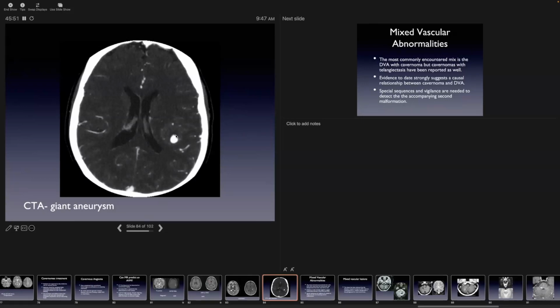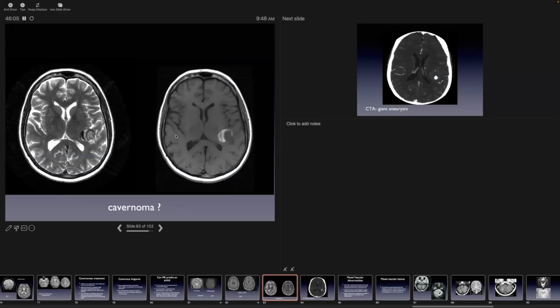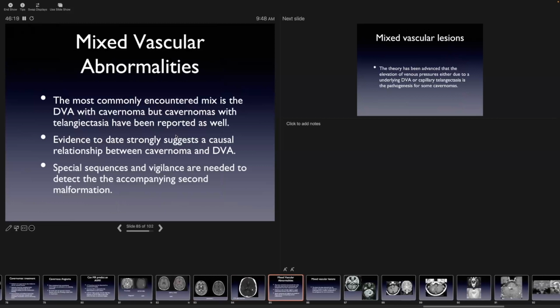These are atypical aneurysms, but again, you have to be aware of these variations and not get too dogmatic about establishing a diagnosis. In a case like this where you say to yourself, well, I'm not sure, that's fine. As I say, in a certain percentage of cases, you're going to be uncertain, and then it's very reasonable to go ahead and order other studies like MRA, CTA, or conventional angiography. Don't be ashamed if you can't make the diagnosis from the MR scan alone.